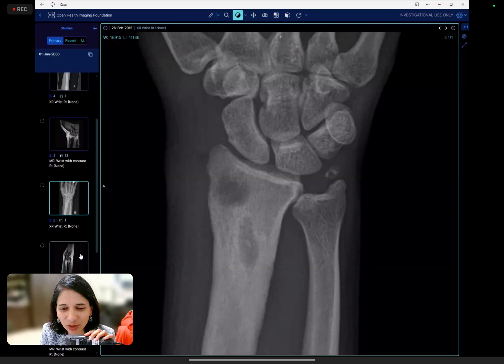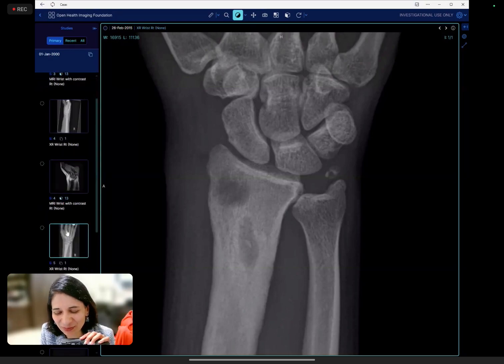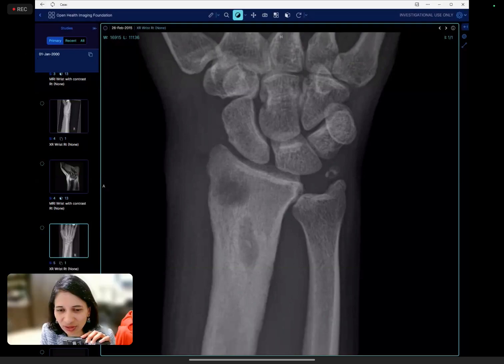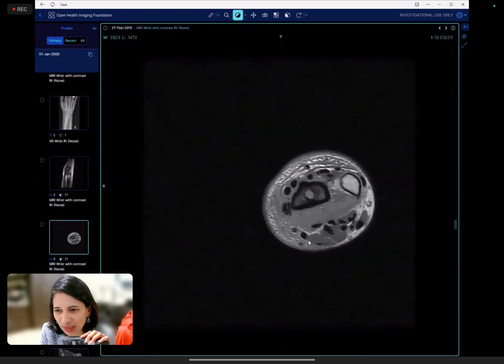So that's why I was trying to push you towards that, because you were giving me mets as the first one. So then I gave you history, that the patient is unwell, thinking of unwell like pyrexial. But I think that sort of put you more, oh, it must be met. But think about it: from here to here, lung met is rare, two of them, soft tissue swelling, all those features. Okay, I'll go more for infection. You can always have met in your differential, but I would say infection will be the main thing here, and also the fact that you have the lesions here.